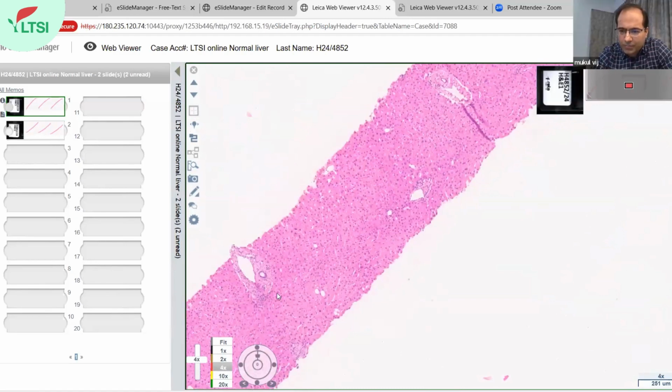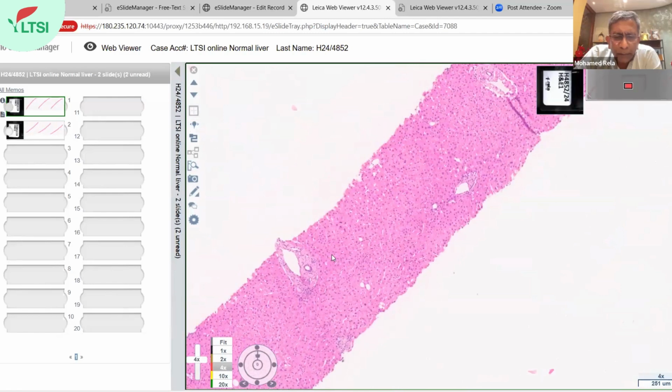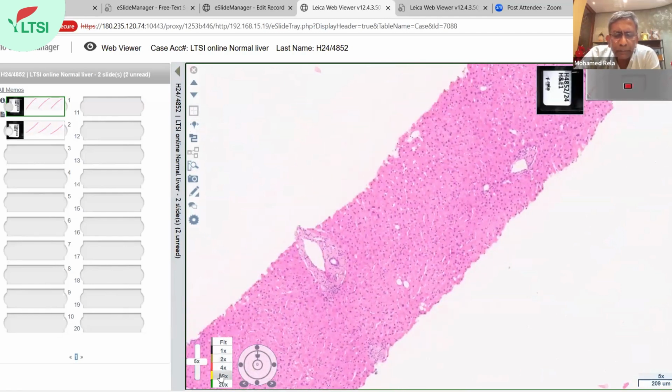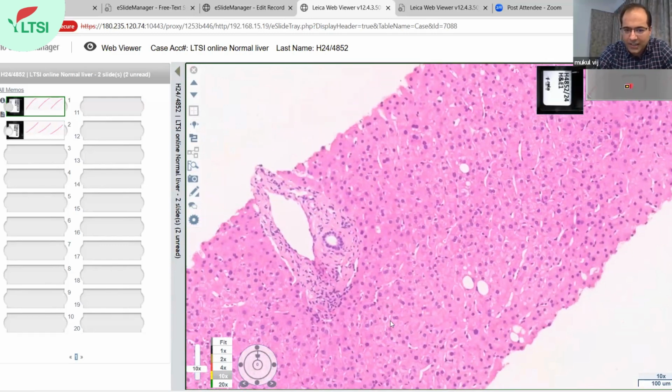Okay, sir. Prof, just to show them the normal liver, the portal area and the central vein. This is also just to show you normal things. You can see a portal tract here, a triangular portal tract. In a portal tract we talk about a triad because of three things. Basically, a portal vein, which is the largest of the structures.